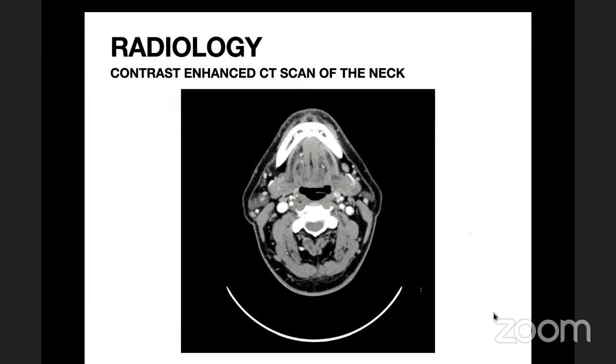So what I wanted was the mucosal margin and a radial margin. Okay, so you have to see the radial margin. It means the surface, the soft tissue. Yes, soft tissue margins. And the mucosal margins may be pharyngeal and tracheal. And that can be superior, inferior, lateral. But here also the tracheal margin will be very important because this patient has subglottic extension. If you come very close on the tracheal margin, Sarbani will be a little more generous on the fields, and she'll probably talk about it now, covering the stoma.